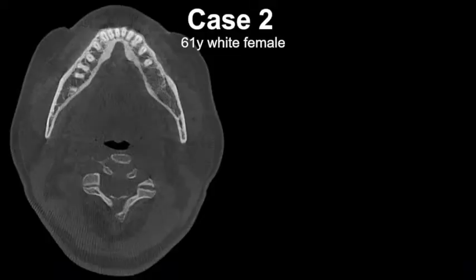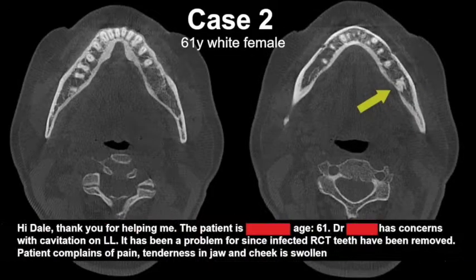Here's a case. The complaint was that the guy said, "Hi Dale, thanks for help. Patient is 61. Doctor has concerns about a cavitation on the lower left." I only have a few of you that send me these kind of things.